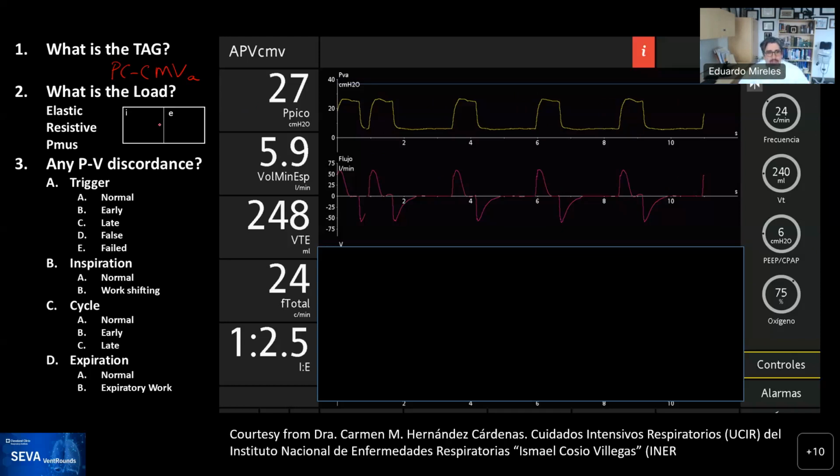And don't get fooled by this first breath over here. Just ignore it. That's just the screen refreshing, so it's not that there were two breaths one after the other. Okay, so I'm going to just cross it so that your brain doesn't sabotage you.